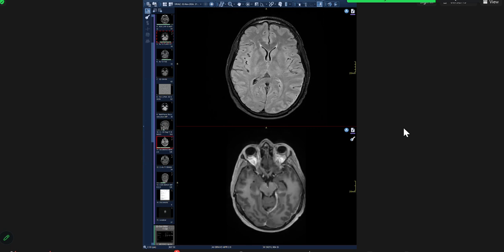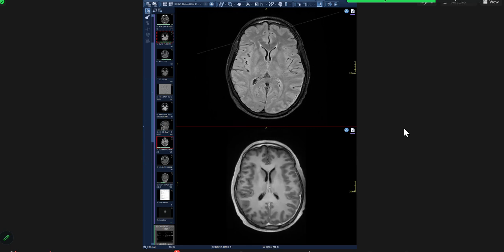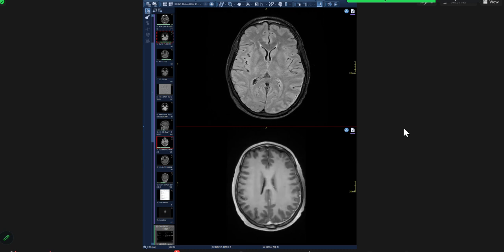If you see meningitis, it doesn't matter if it's asymmetric. Don't get worried because it's asymmetric. It could be early phase, it could be any phase. This patient, like I told you, is an early phase, and he does have more. And always remember that imaging doesn't show meningitis as much. The patient would have severe meningitis and imaging is going to show very mild enhancement. So don't get confused by the degree of enhancement, or if it is asymmetric.